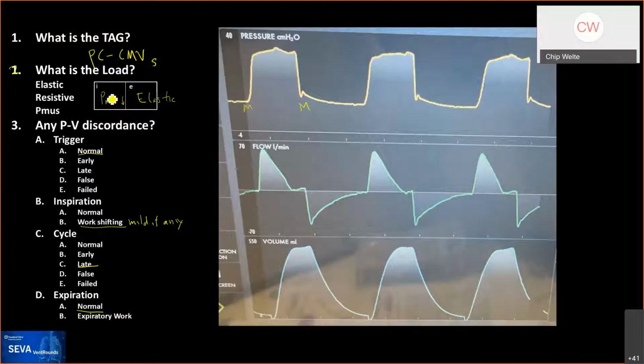And then your eye keenly recognized that there was some PMUS. Can you guide me where you saw the PMUS? I mean, it is like the most mild PMUS of all time, but the flow degradation really looks more linear than exponential. So I think there's a very small amount of PMUS there, and then that increase in flow right at the end there is also kind of interesting.